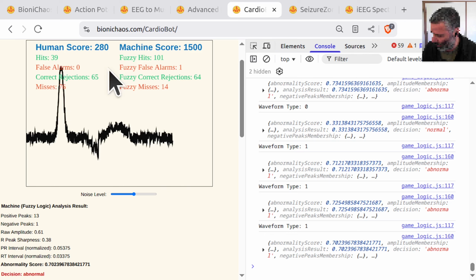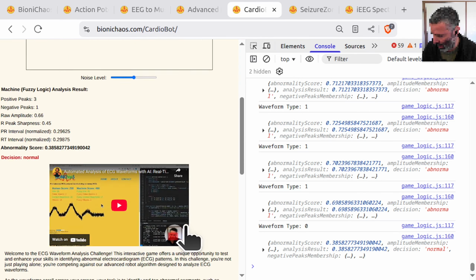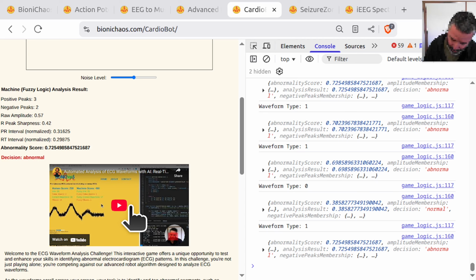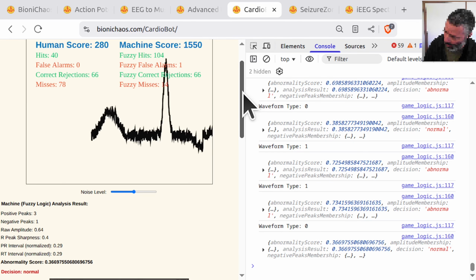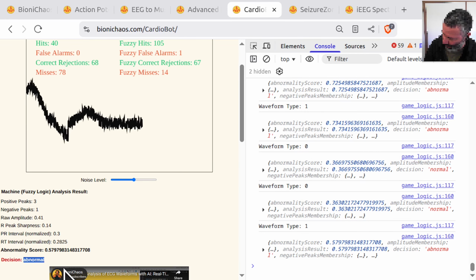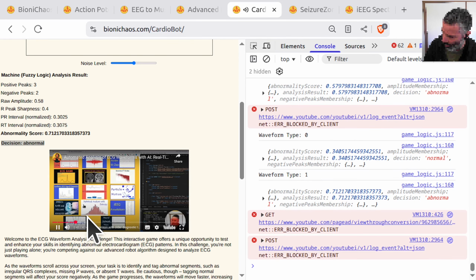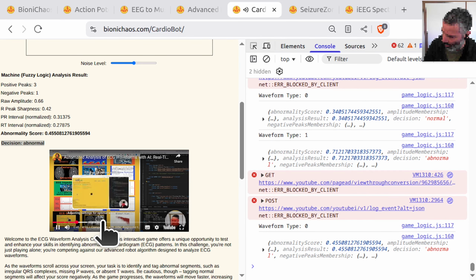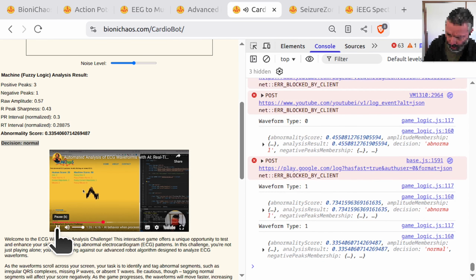It's mostly working. Don't like that YouTube error. We have a YouTube video embedded on the page. Probably get rid of it to avoid that error. The decision there is the one the robot makes. Is that video not working or what? The tool was published a while back, and that one didn't have this. Yeah, it got one false alarm there.